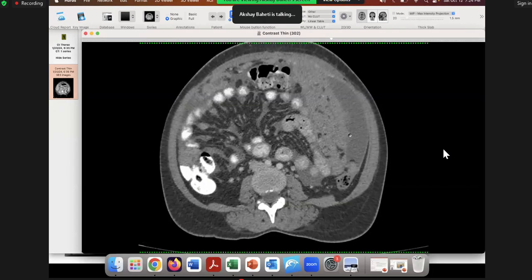Where is the mesentery? I'll ask you, and you tell me whether it's mesentery or not. Is this mesentery? No, sir, that is omentum. Okay. Is this mesentery? Yes, sir. Excellent. Is this mesentery? Yes, sir. Very good. So this is all mesentery. Everything central is mesentery. All the fat which is central to the bowel loops is going to be mesentery.